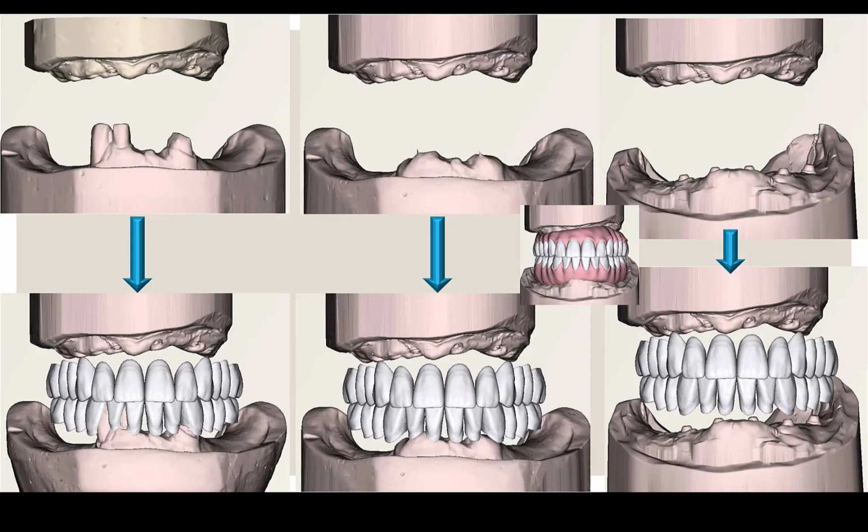When thinking about the broader picture, the software is designed to archive and manage the multiple stages or levels of patient care. It is important to note that with PDC, the same tooth design can be used even when the underlying models change. For instance, if you retake an impression or correct a mounting, it just requires that you scan the remounted model and have it replace the previous model. The spatial tooth arrangement will not change unless you want it to. Previous scans and other work are all archived and readily accessible as a reference.